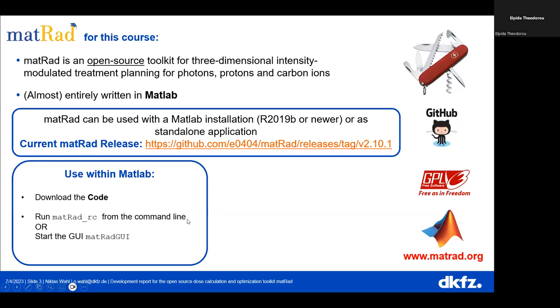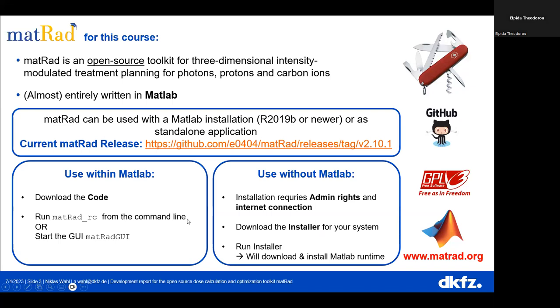If you don't have MATLAB and you just need to install, you can download the installer. There's one problem with it, which is quite annoying, and we haven't found a way around it. On your computer, you need to be administrator. So if some of you join from the clinic, that might be an issue. The second thing, which everybody should have because you are on Zoom with me, is an internet connection. You need to download the installer for your system. There is a Mac, Linux, and Windows installer.